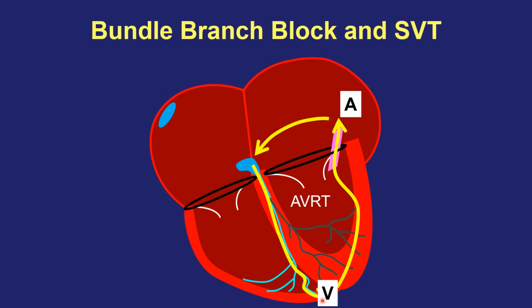So the start of the QRS to the time it takes to traverse all that extra myocardium and get back up to the A is going to be longer. So here you would in fact impact the cycle length of the tachycardia in this scenario if you had an ipsilateral bundle branch block. There's an asterisk there that I'm going to review in a moment.